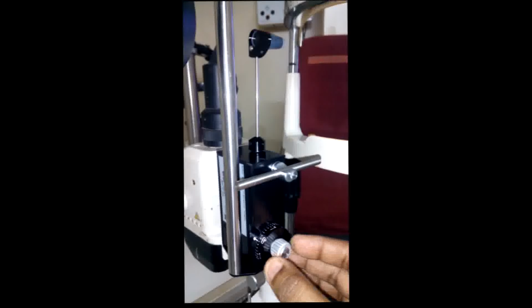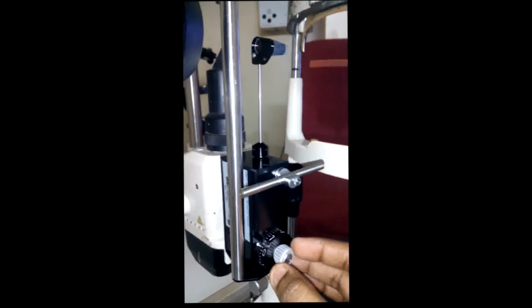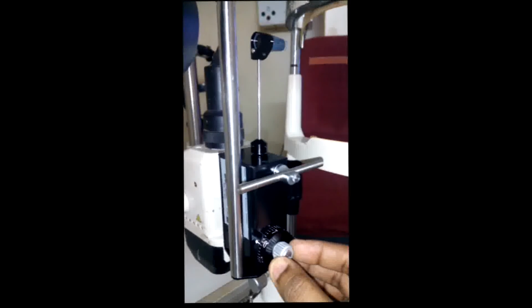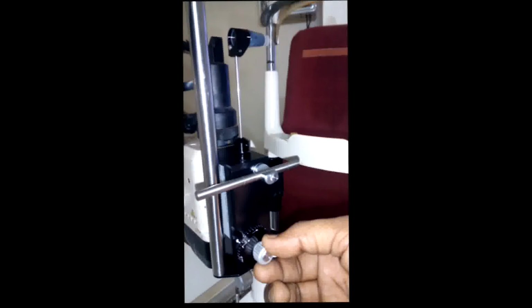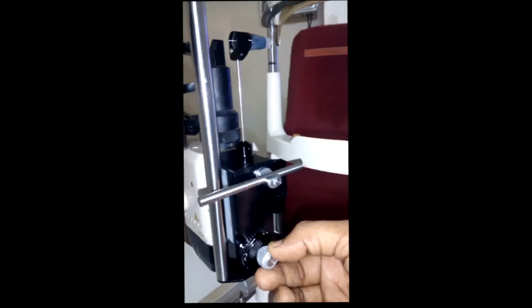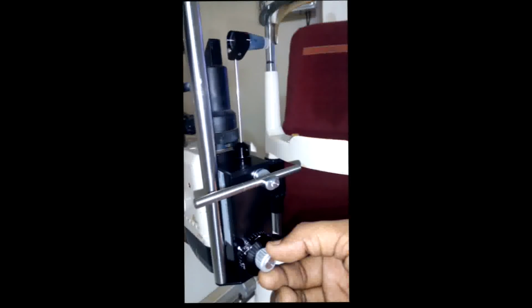The calibration rod is inserted in the holder at dial position 0. At dial position 0, the feeler arm should be in free movement. If the dial is turned backwards, the arm should fall towards the examiner. If the dial is turned forwards, the arm should fall towards the patient. If the arm doesn't respond in this way, the tonometer is inaccurate at dial position 0.